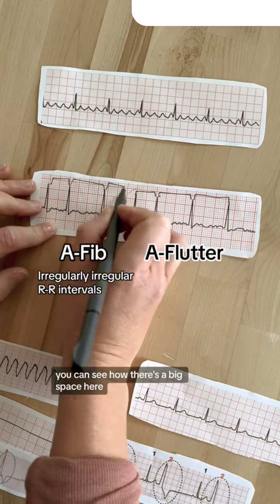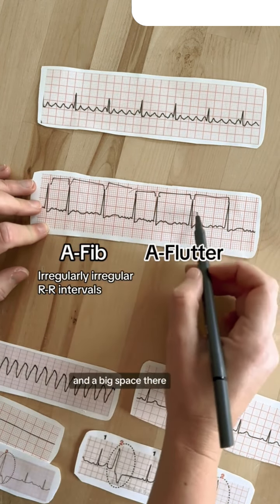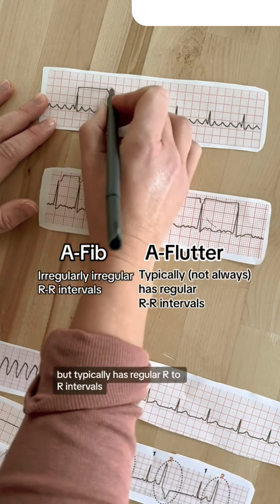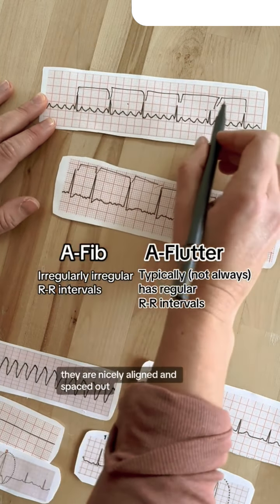You can see how there's a big space here, a small space here, a small space here, and a big space. They're irregularly irregular. Where atrial flutter typically, not always, but typically has regular R to R intervals. They are nicely aligned and spaced out.